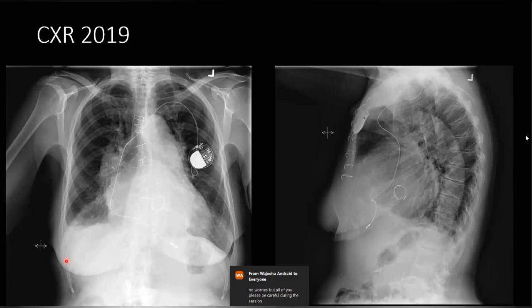I used to make the same mistake. Don't say pacemaker, just say intracardiac device, okay? Because you do not know whether it's a pacemaker, a cardiac resynchronization device, or an ICD. Just say intracardiac device, or some electric device, probably an ICD, because it's a single lead. The patient is young. I don't think they would do a pacemaker. They would just put an ICD.